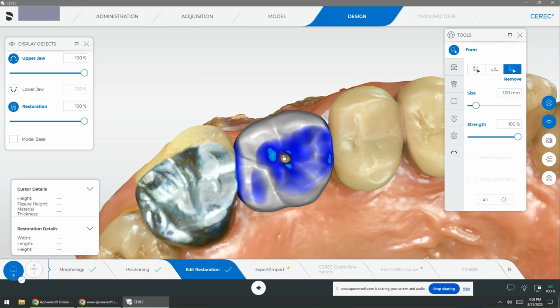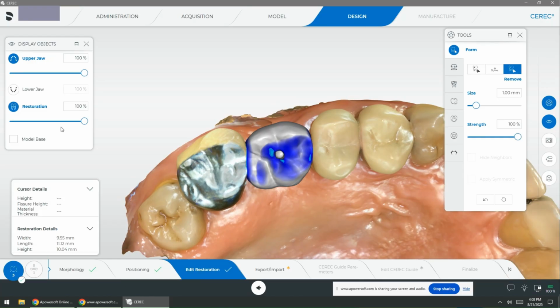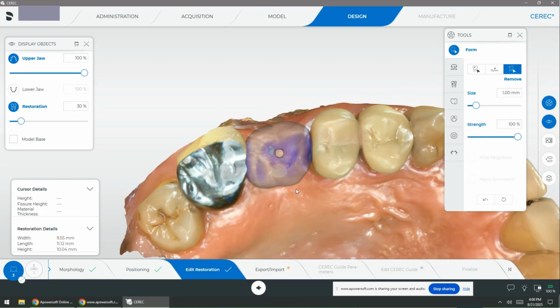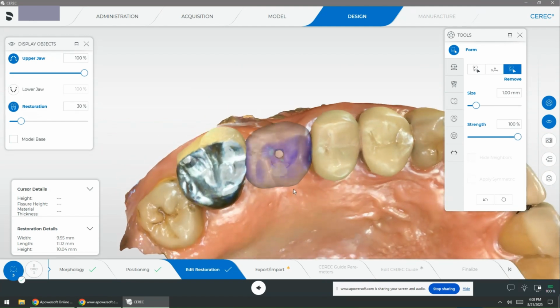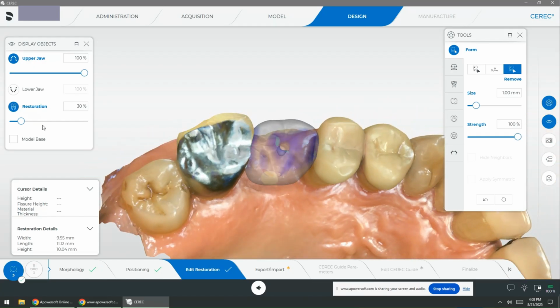They show it to you. If you don't like it, you go back and forth. So it's better that you understand what your patient needs, then plan it with the generic tooth. Now, going forward, we're looking for options to have a proper implant planning software that does all this, especially in the Sirona CEREC environment. But right now, we're not there yet. So this will be the more efficient workflow.